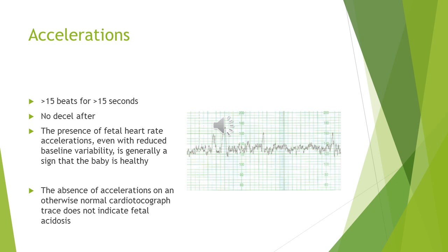So if you see the acceleration in the intrapartum CTG, it's a reassuring sign. However, its absence is still a normal CTG. So if you see an intrapartum CTG and you can't find an acceleration, it still can be a normal CTG. But please, it's different from an antenatal CTG. In antenatal CTG, acceleration is a must, you need to see an acceleration in response to fetal movement. But in intrapartum CTG, it is not a must.